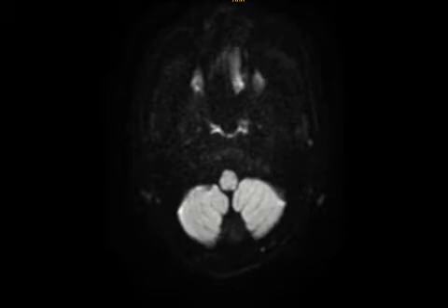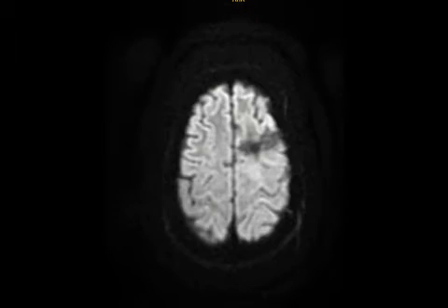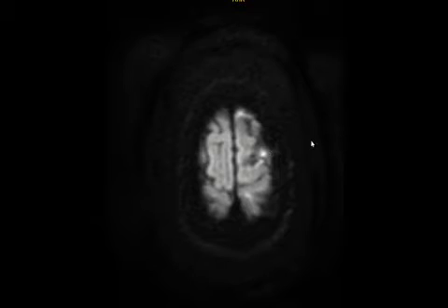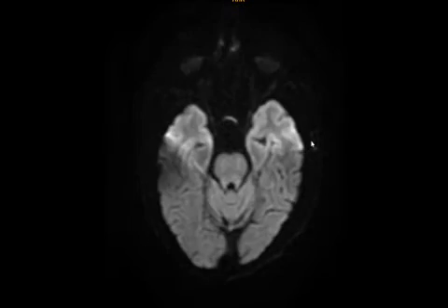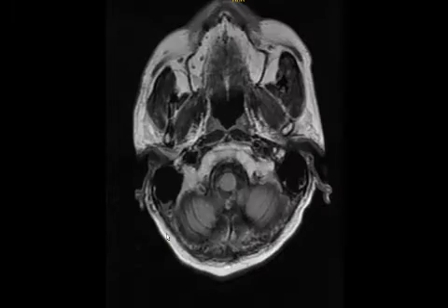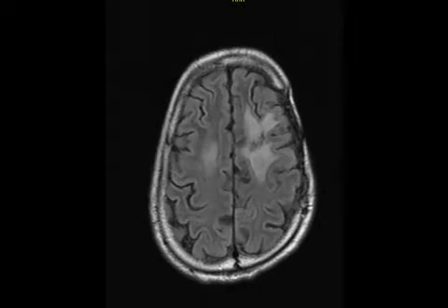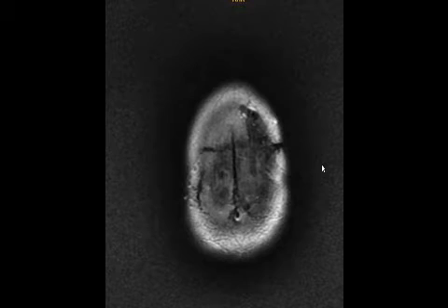So this patient basically had a glioma operated. This is a scan one year ago in 2019. You can see a focal diffusion maybe there, maybe not there, but no other lesion as such. I show you a FLAIR, and there is a mild periventricular hyperintensity. There are signal changes around the resection.